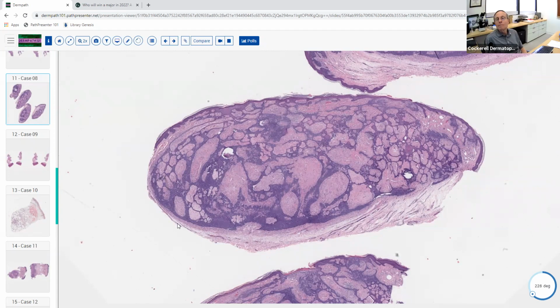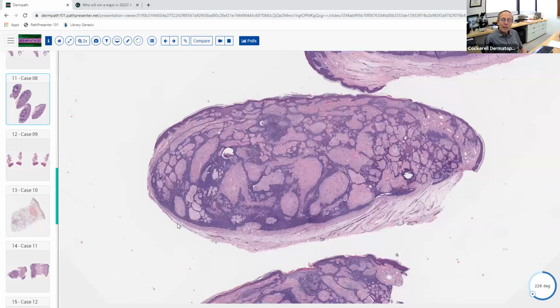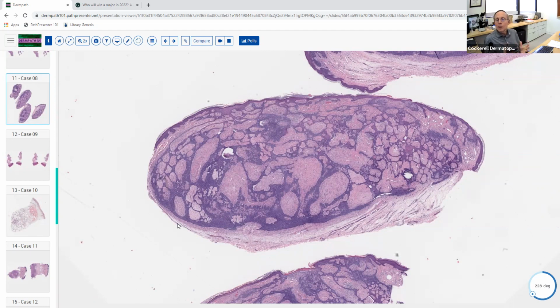Which type of epithelial? Basal cell epithelium. Well, it's basaloid. Yeah, basaloid. You're right. Now, obviously, if something is basophilic, basaloid, that can come from a couple of different structures. So we think about differentiation of epithelial neoplasms in the skin. We have to think about what normally lives there. So what normally lives in the skin that's got some basaloid cells in it somewhere? There's a few things, but there's one major one that does.